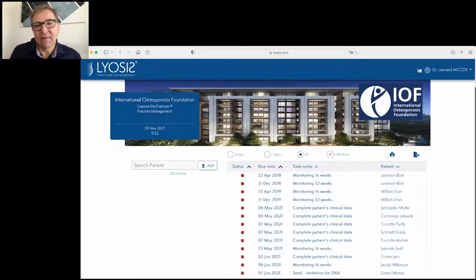If you are logged in to the software via any browser, you see this dashboard, with a lot of functionality, but I want to show you a typical workflow. That would be the easiest way to understand how the software works.